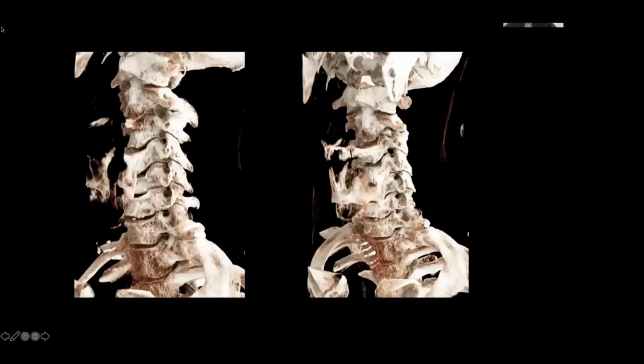And again, by looking in different obliquities, you can get a sense of the actual trajectory of that neural foramen. I think looking on axial sections or on single cross-sectional sections, you tend to have a sense that the neural foramen just courses in one direction, and it doesn't really do that. You can see that it's actually a nice little tunnel that can actually lobulate over time.